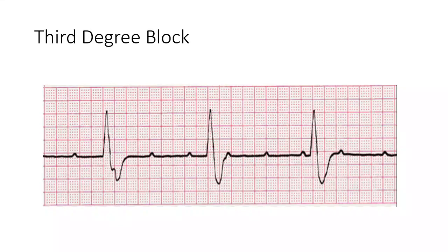Yeah, it's in the QRS. It's that right there. Okay. How do I know it's there? Look at the other 2. That's not present. So that is our P wave. All right. If we put our edge of our paper here, it'll line up here, it'll line up here, and moving across, all of our P waves are regular, just like soldiers marching across. Next thing we do, same thing for our R to R. Measure from here to here, and then our next R to R is going to be the same.